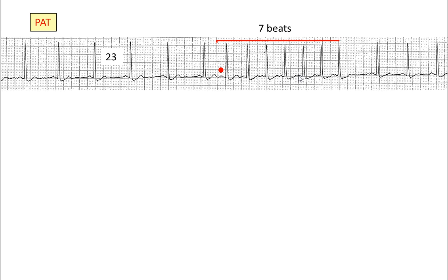There's still something in here because I'm seeing 2 lumps. There's still 2 lumps. So this is all the same thing. We start out a little bit on the slow side, and then here, and here, he's 11 little boxes between our waves. You can handle the heart rate in this section one of 2 ways.